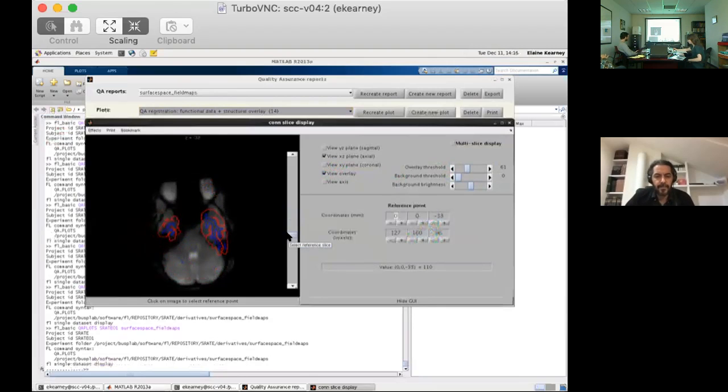But then if we look at subjects 3 through whatever, there are a couple of things. One, it seems like on some of them the alignment is okay, but maybe not fantastic. Some of them seemed pretty good. But in those, when you look at the functional data, it doesn't look like what I would expect an unwarped functional volume to look like. I was thinking after we talked that maybe it's because more recently I've been looking at the DTI data, where you do see a pretty big change in what the data look like in those problem areas.